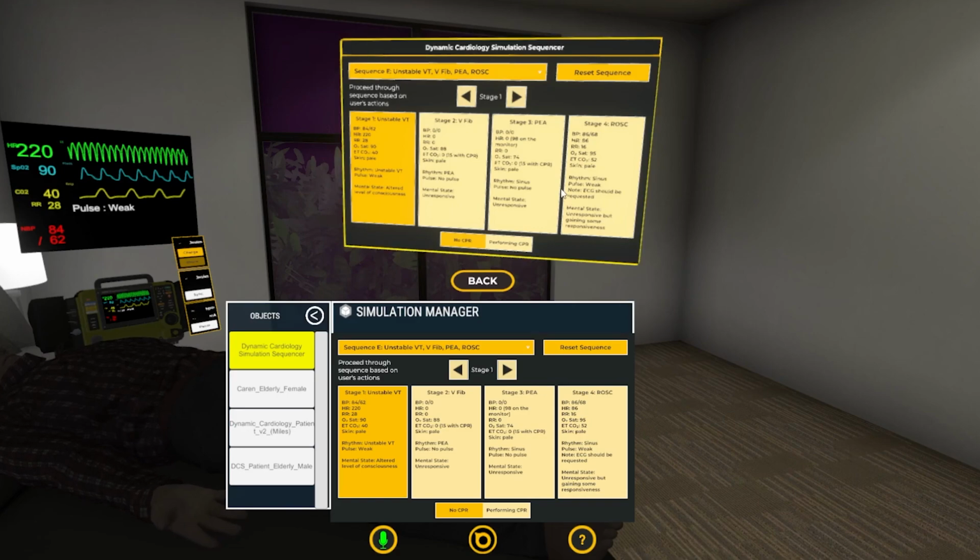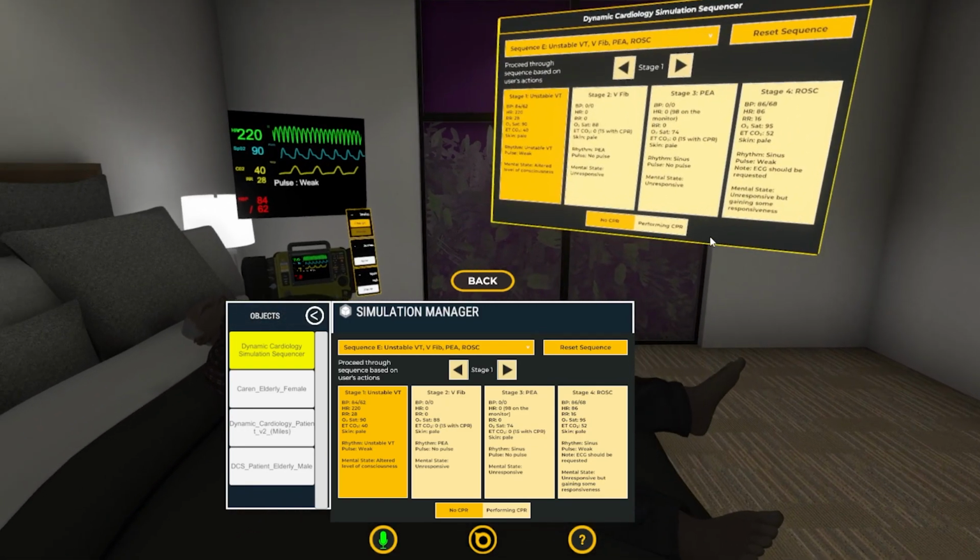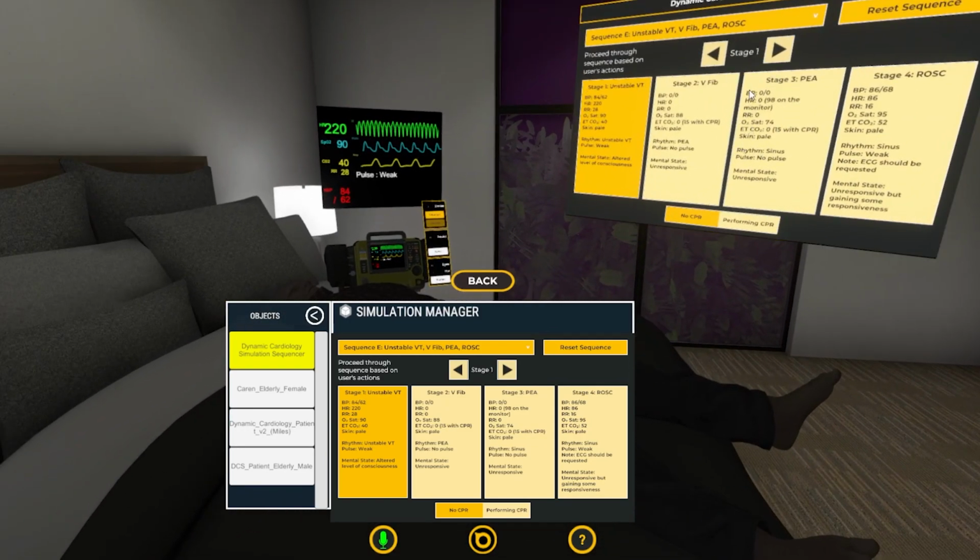But if you're in VR, you can actually just take this and stick it right onto the wall or something like that. I just put it hanging out here in the air, and then you'll have that right there in front of you. And again, you can make this invisible to the student, so the student will not see it, only you. Okay? Only you.